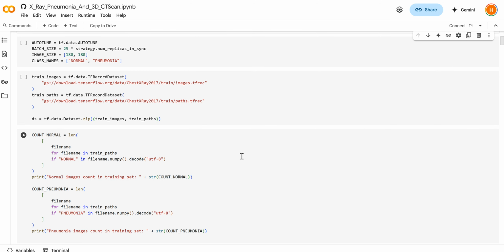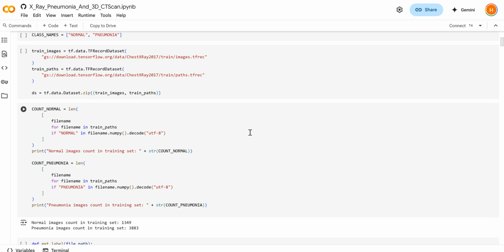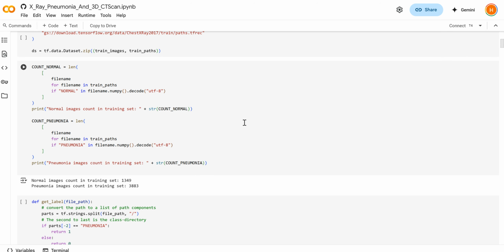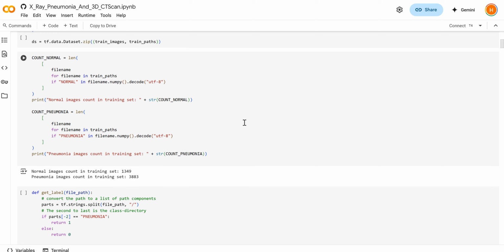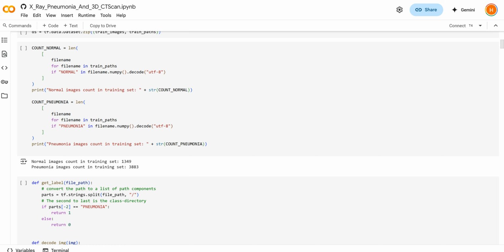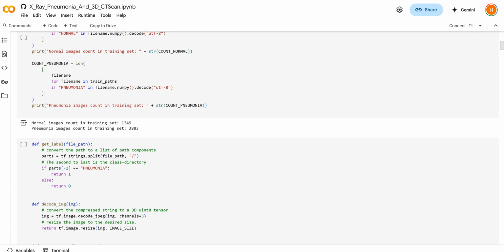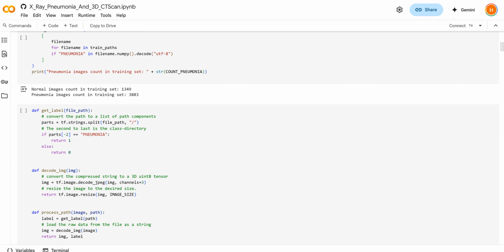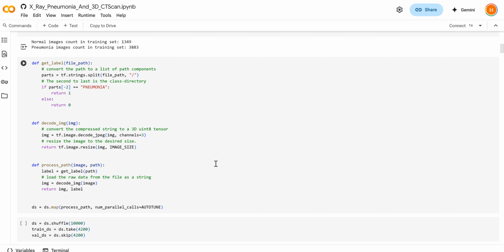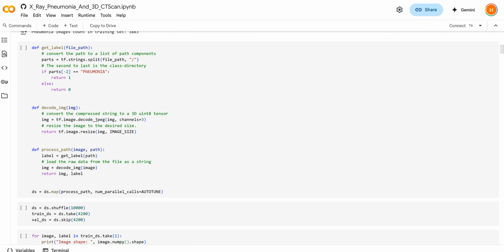So our CNN stacks separable convs with batch norm and max pools, and then three dense blocks with heavy dropout. We compute an initial bias to offset the class imbalance, 3.8K for pneumonia versus 1.3K for normals, and pass class weight into model fit. After just one epoch, you get 75% training accuracy and 86% for validation, with precision around 0.93 and recall greater than 88%, which is critical for catching true pneumonia cases.